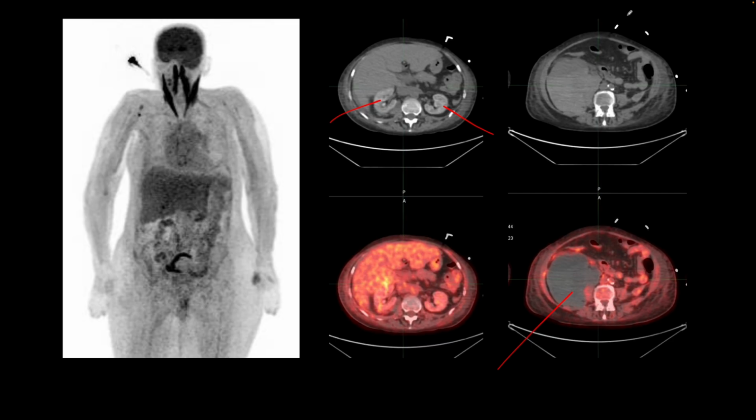There's a large hematoma. It's a hematoma because it's hyperdense on the CT, and it shows some layering or different attenuations. And so they were on anticoagulant treatment, and they bled in the retroperitoneal space. Now there is this large hematoma. Their intravascular compartment has contracted, because of which they have developed pre-renal azotemia or acute kidney injury.